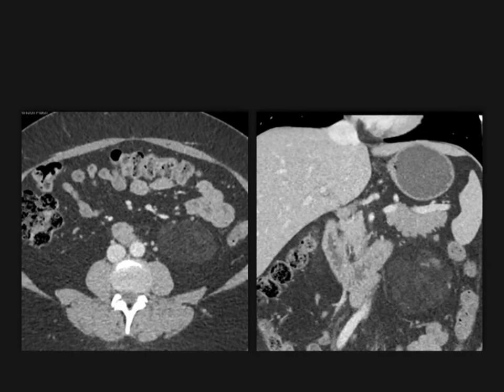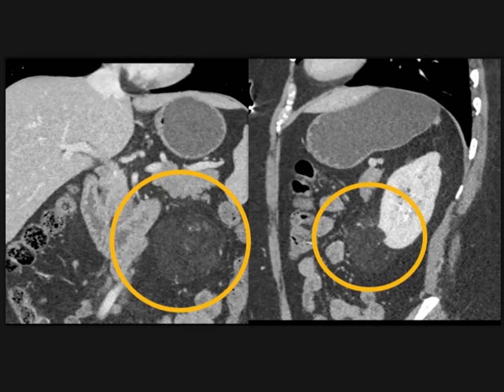Now, this lesion, based on size and some of the vascularity, would probably be resected, because you would want to prevent this from going on. This was growing, and you would hate to have this rupture, and you can see it very nicely there.